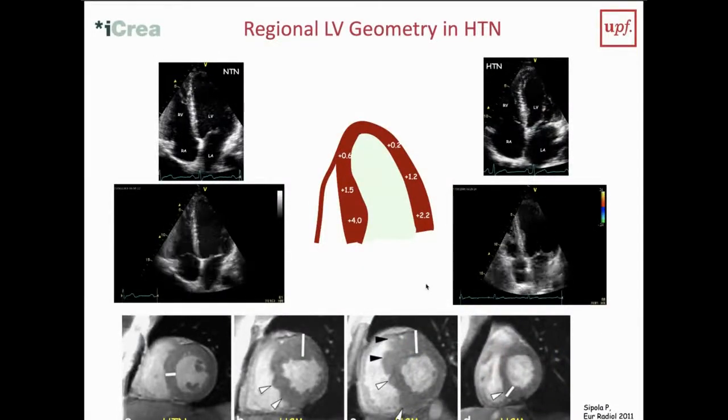And so we can use this then to look, for example, at local geometry, because I said that this is one of the things to do. And for example, here, what you see is a normal patient. And you nicely see that this wall is very homogeneous. So it has the same thickness everywhere. And what you see here is actually this patient looks like this bulb here. So you see that locally here at the basal part of the septum, so close to the valve, this is thicker than normal. So you have localized hypertrophy. And here, this is shown with MRI, also different patterns of hypertrophy.